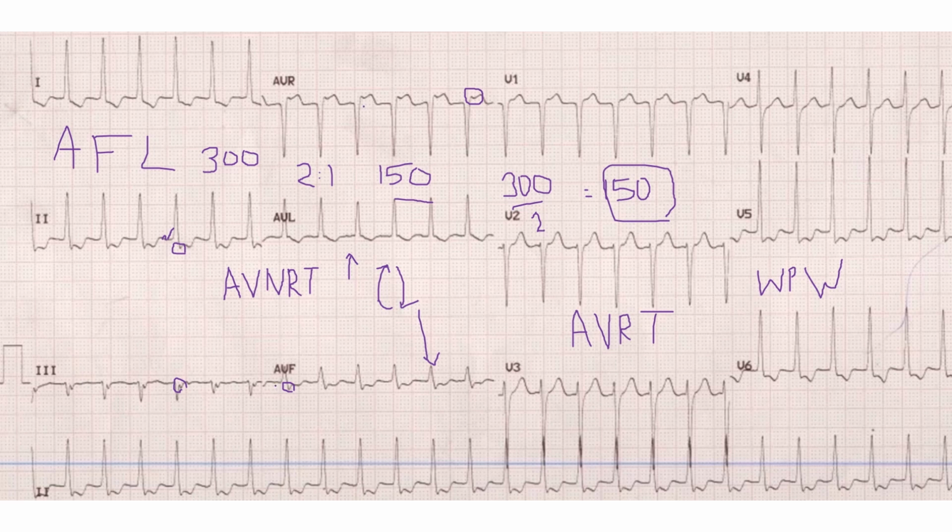So you could also try giving a careful carotid sinus massage to slow the ventricular rate and see if flutter waves are appearing in between. During termination of this tachycardia with adenosine also, initially if the flutter waves are there, they may appear more prominently, because when the heart rate slows down, flutter waves can be seen easily.